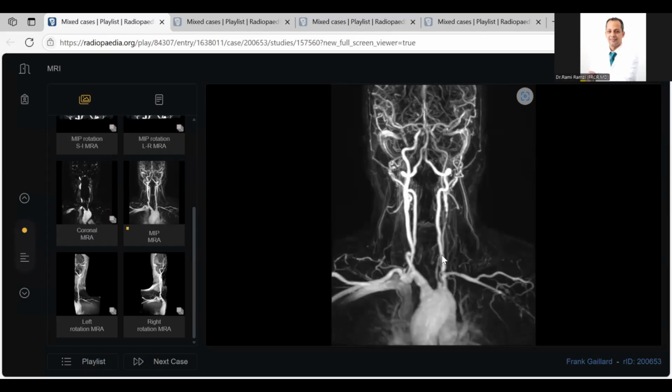Also, I'm concerned that there is a little focal stricture at the subclavian artery on the left. I think there's narrowing in this segment here compared to, well, it seems quite large on here. What happened here also?